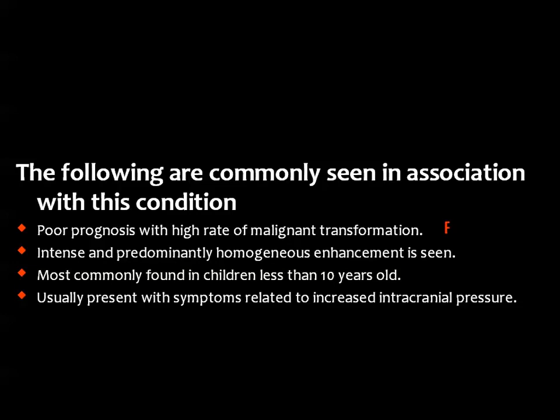Yeah, the meningioma is a benign lesion. Intense and predominantly homogeneous enhancement is seen. Most commonly found in children less than 10 years old? No, intraventricular meningioma is found in adults. Usually present with symptoms related to increased intracranial tension. Yes.